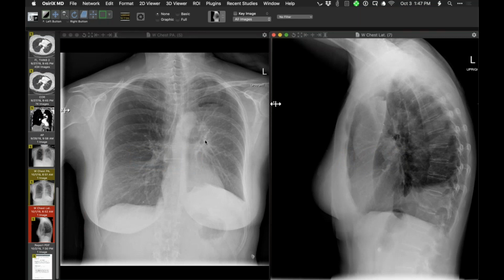So they're talking about actually maybe taking out these valves. Maybe I'll just take out one, hoping this lung will expand better. There's still some pleural fluid in the volume loss that you see there. So undoubtedly pneumothorax ex vacuo in this context.